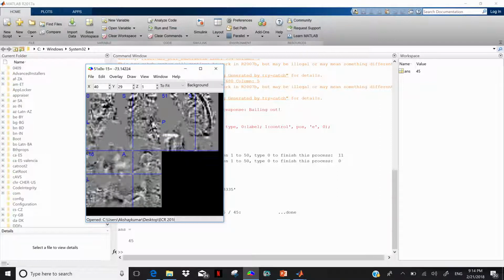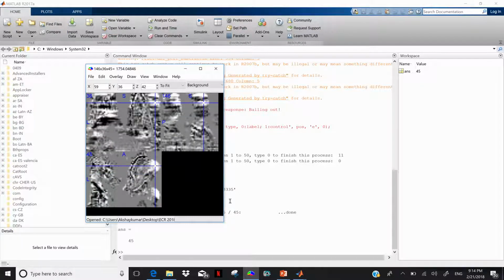Now one more thing you need to remember here is, look at that. That's the tumor here. Yes. So one more thing you need to remember, which is very important, is that it will be shown in the opposite orientation. For example, for radiology people, this is very difficult to understand, that this is left and this is right. This is so technological, right?